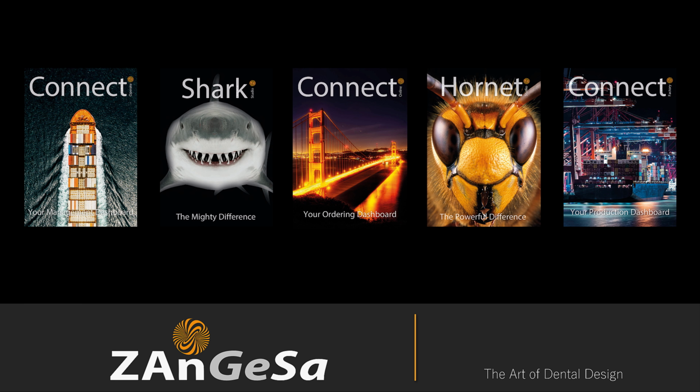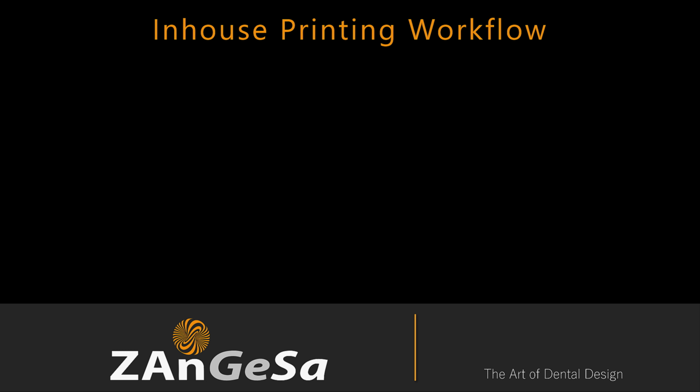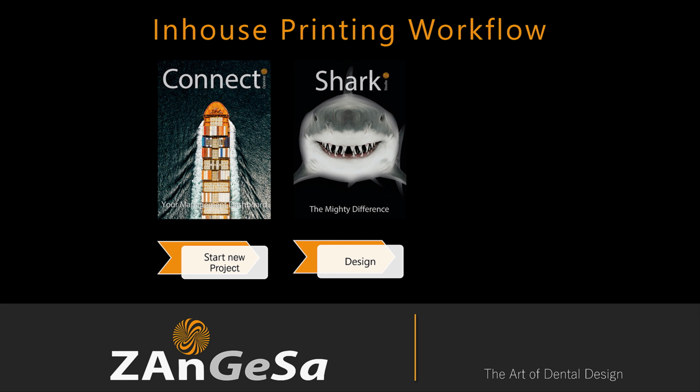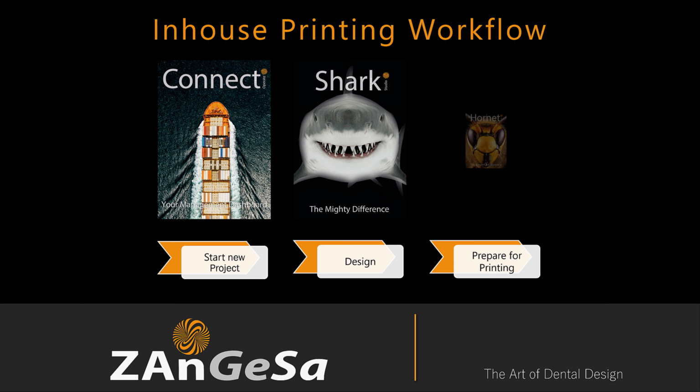In this video we want to give you a short introduction into the in-house printing workflow. For this workflow we will start a new project in Connect Operate, then we will design it with Shark Studio and finally we will prepare it for printing with Hornet Studio.